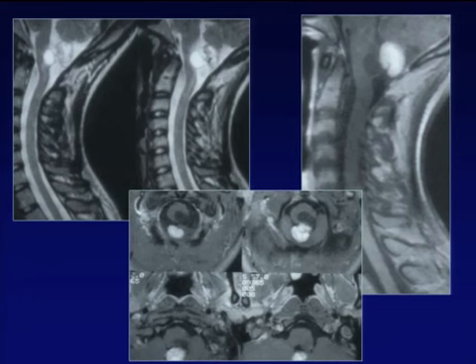You see post-contrast without enhancement. And this is the nodule, which in this case is larger, which enhances. And sometimes hemangioblastomas, when they cross the craniocervical junction, may produce non-specific neck pain. Remember this. We're dealing every day with many cervical MRIs, dealing with degeneration, of course. This is the main issue. But remember to look upwards to the foramen magnum. Sometimes you can come up with a diagnosis like this, hemangioblastoma crossing down.